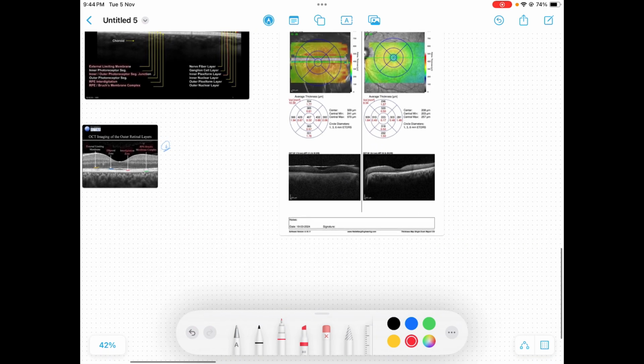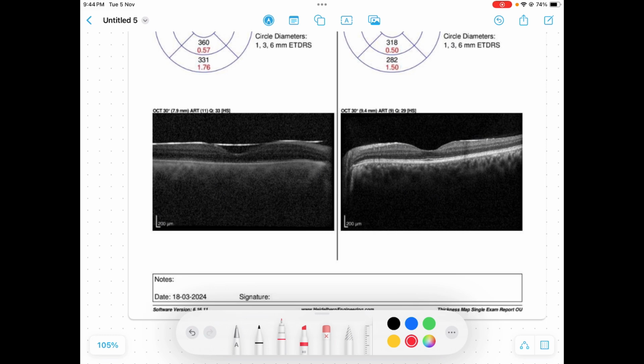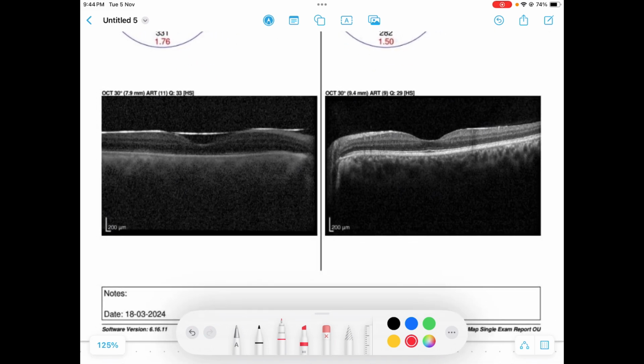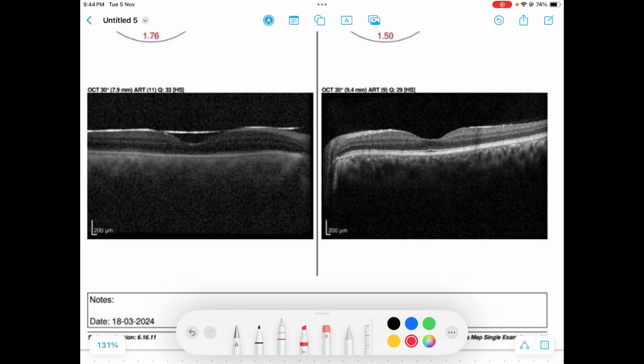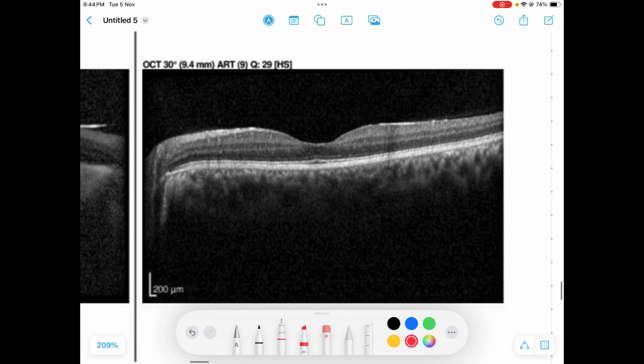So coming here, this is an absolutely fresh OCT imaging of the macula. When describing an OCT macula, first we comment on the vitreous, the posterior hyaloid if there is an attachment of it, and then we start with the layers. Let's discuss the four hyperreflective layers first.